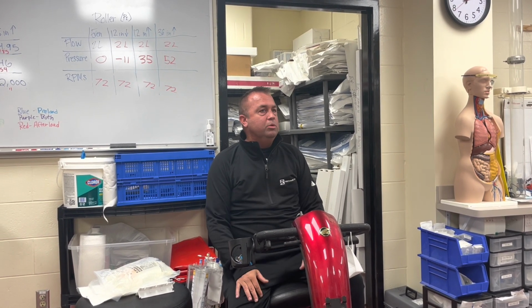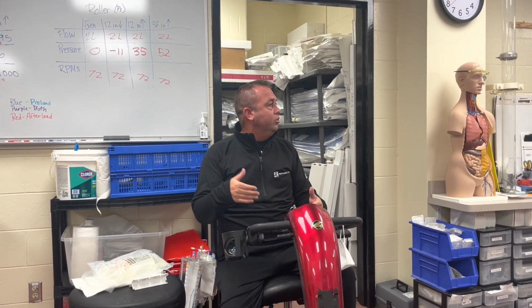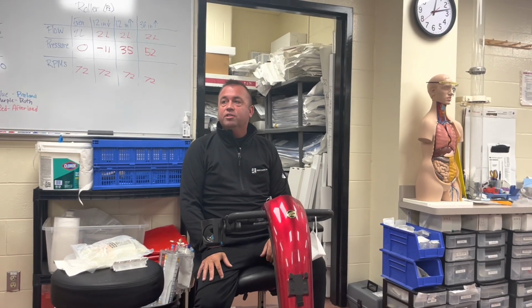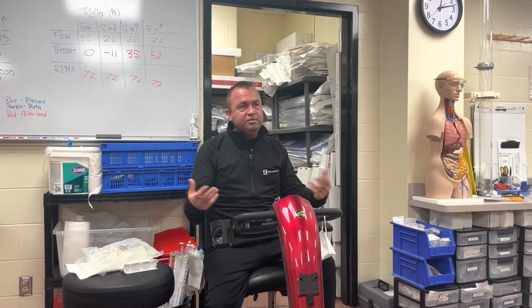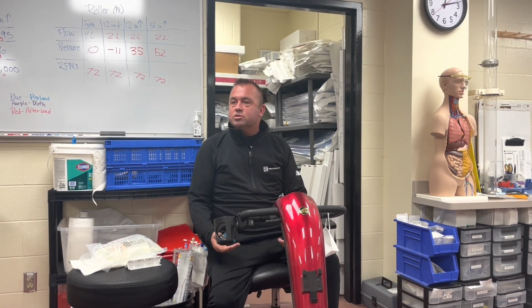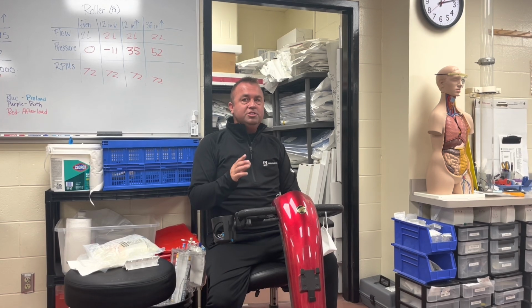It gives us a better pressure off of our femoral artery than the smaller arteries as we move down the line. Some people say, well, why wouldn't you just put a femoral in right away? There's a surgeon, Dr. Geist, in Iowa and Illinois. He puts a femoral line in every single patient because, like, oh, every single patient I have, the radial line gets dampened, so he puts in a radial line and a femoral line. You'll have other people say, well, that's overkill. You're going into a major vessel. It gives you a greater chance for infection and different issues that come with repairing that vessel. So some say it's overkill. Different trains of thought.